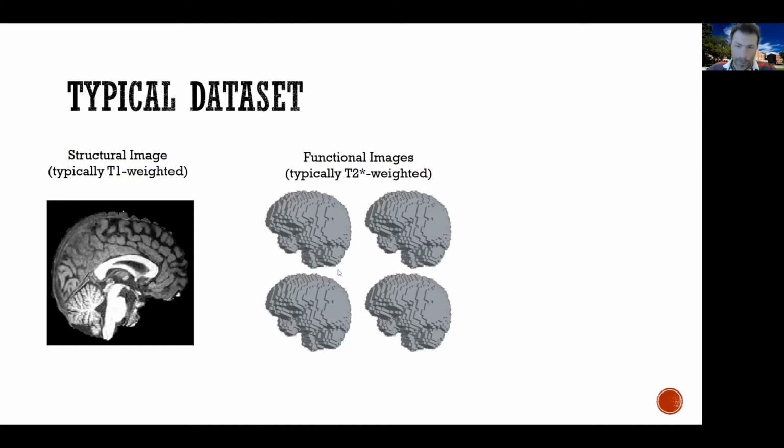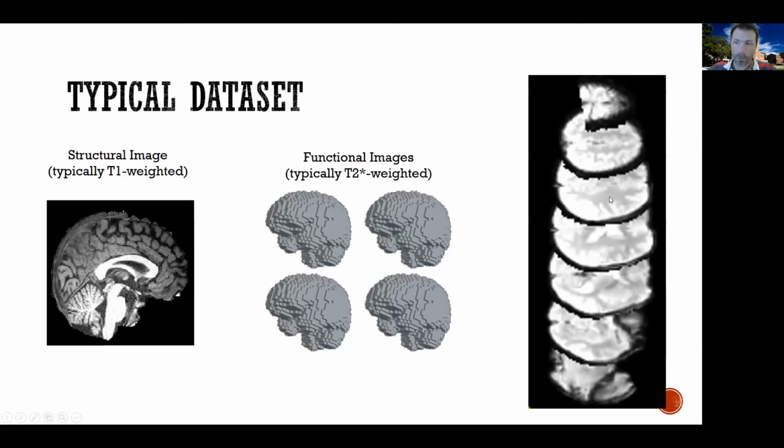And each of these images, as you know well, is typically acquired in a number of slices. And also worth pointing out, whereas the structural image is typically highly detailed and has high resolution, the functional image usually has lower resolution.